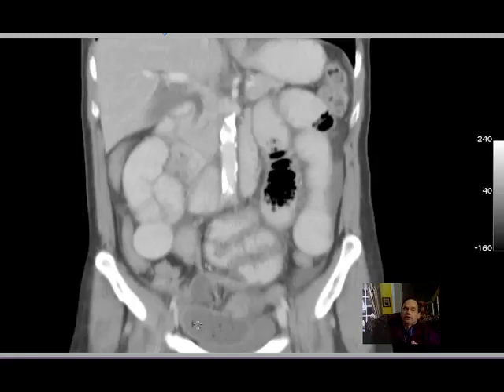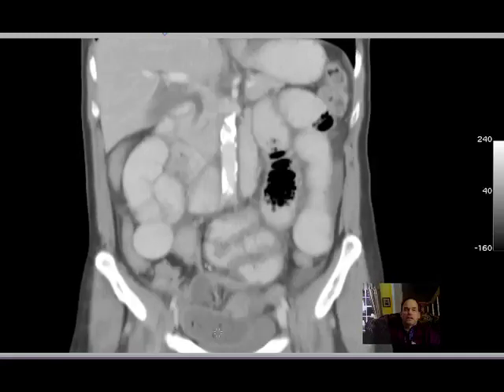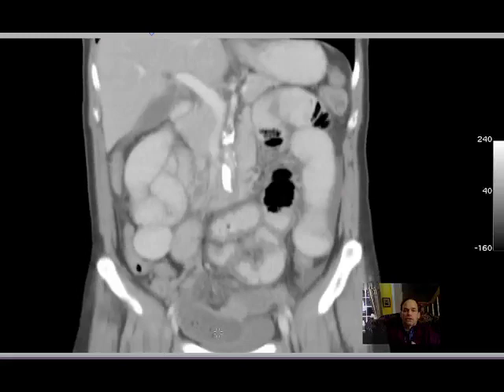Here is also what they call the small bowel stool sign, and it is not one of the best examples of it, but it is sufficient. What it is showing you is that there are these little speckles of air, which generally you don't see in small bowel ever, or nearly ever, okay? And the reason is that if this is the small bowel, and you have a narrowing in the bowel like this, at that point the bowel is trying to push it through.